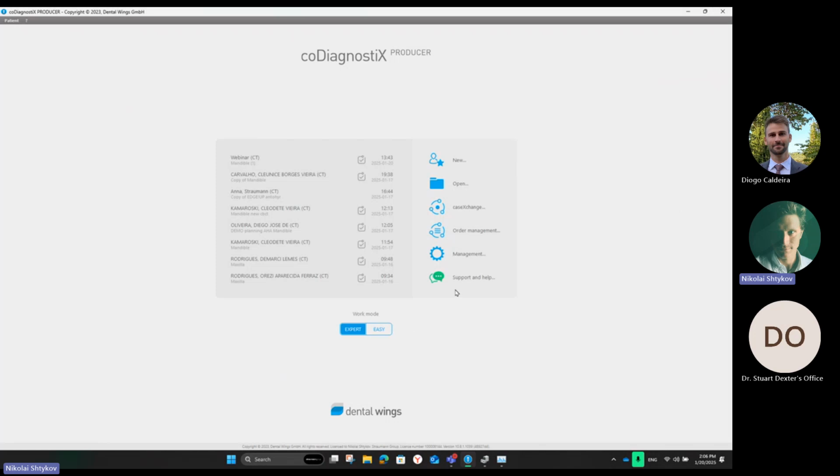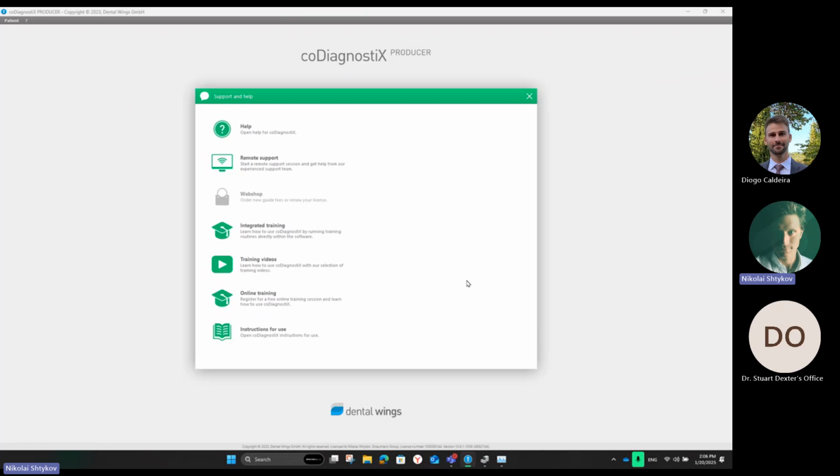One of the most important buttons is support and help. When you start working in coDiagnostiX, you have questions, and here you can find answers to your questions. You have instructions, you have online trainings. Online trainings are the trainings like the one you are attending right now. If you click on this, it will open the coDiagnostiX website, and then you can attend the meeting.